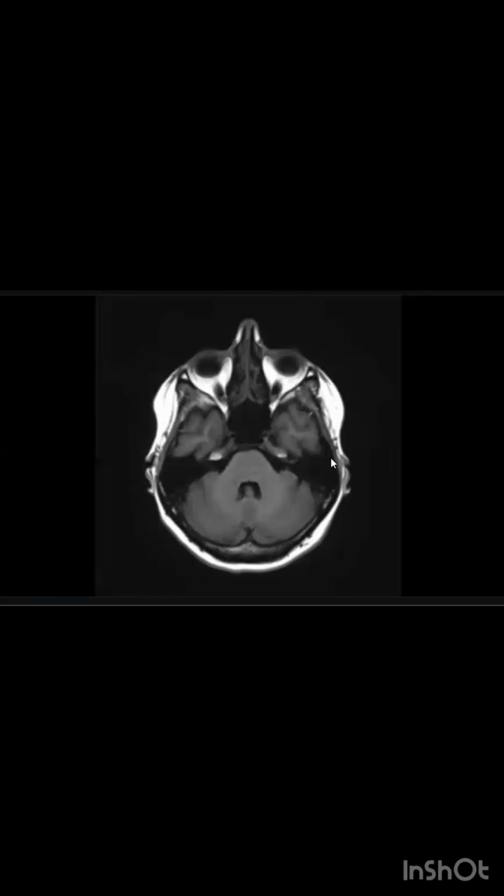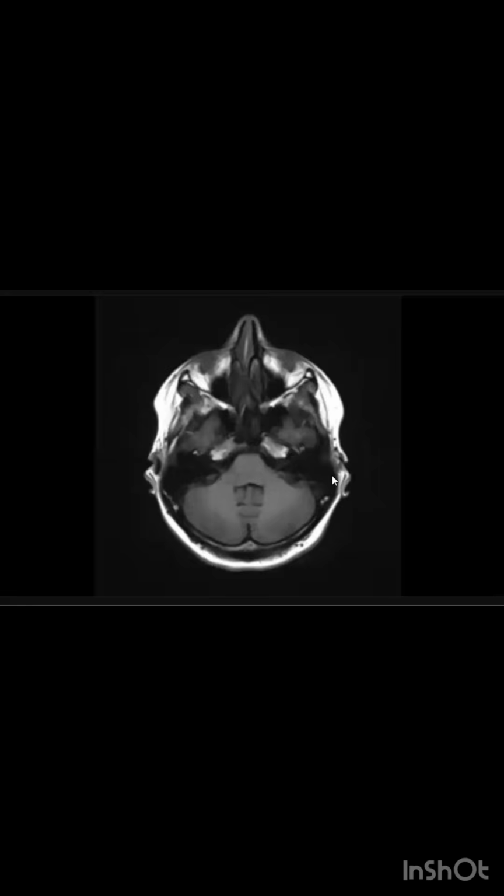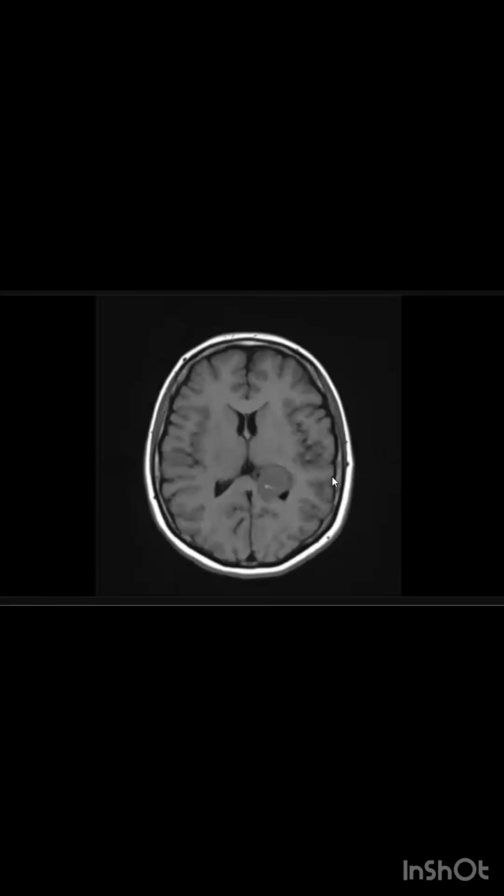Okay, what is the sequence? Can I check the T2? Can you check again, please? Sorry, I can see the same sequence, doctor. Yes, I am asking, what is the sequence? I would like to see T2 to see the signal in T2.